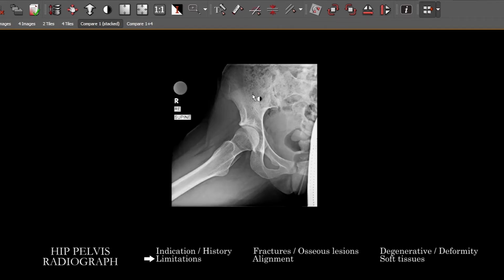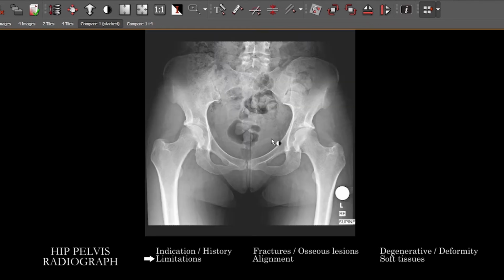All right. And so once we get a sense of the overall patient picture and take a look at the priors, you want to get a sense as to whether there's any sort of limitations, particularly for the lateral view. If it's foreshortened, it can be very easy to miss subtle fractures. If there's a lot of overlying soft tissue, if the exam is degraded, it is extremely easy to miss subtle fractures of the femoral head-neck junction, of the acetabulum, of the osseous pelvis on radiograph. So if the study is limited, and especially if the patient can't ambulate, or you have really any sort of suspicion for subtle or occult fracture, have a very low threshold to pursue repositioned repeat examination or CT or MRI.